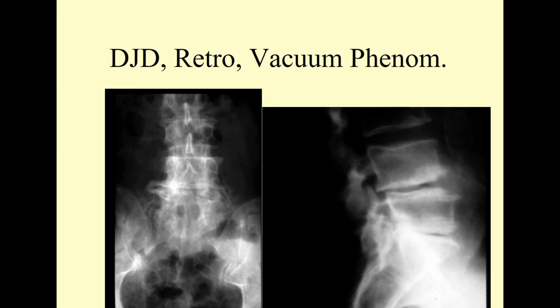But as long as we recognize that there is a way techniques use information, and there's a way that the rest of us use information. So for our class, this will be an L4 retrolithesis because it clearly is extending posterior. Now, if you don't like this position for some reason, all you really have to do is have the patient lean forward, and it's going to go anterior.